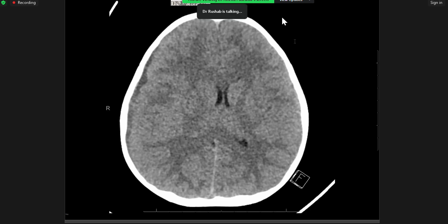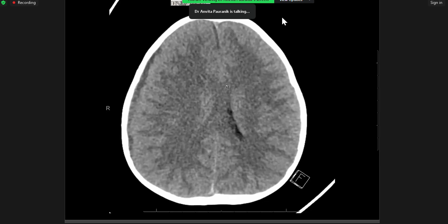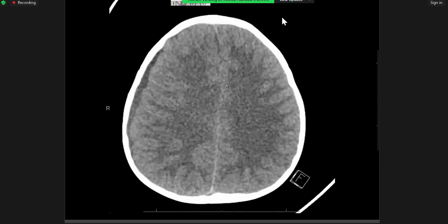Subdural hygroma will have similar attenuation as CSF, ma'am. And effusion or collection will have more attenuation, but less, could be more. And in terms of etiology, is there any difference? Subdural hygroma can be a chronic sequela to a chronic long-standing SDH. Okay, all right. So finally, somebody has asked the right question.